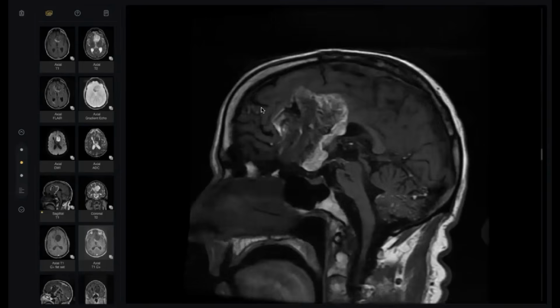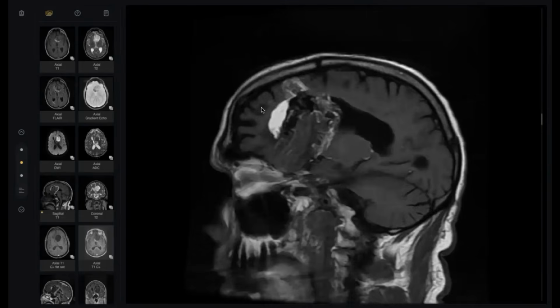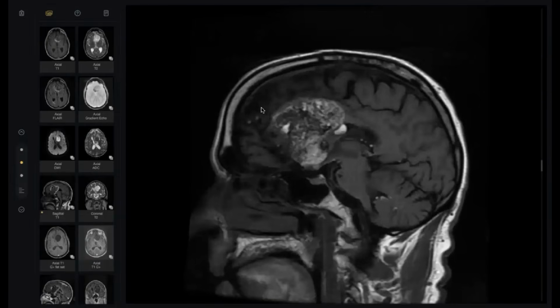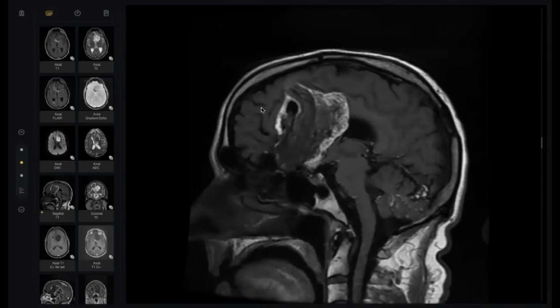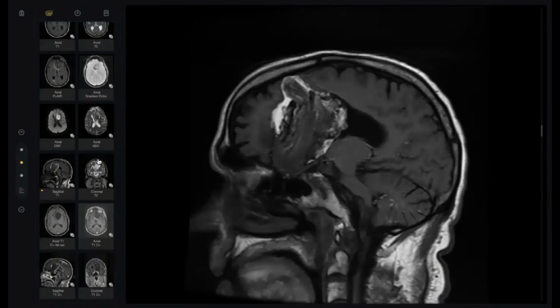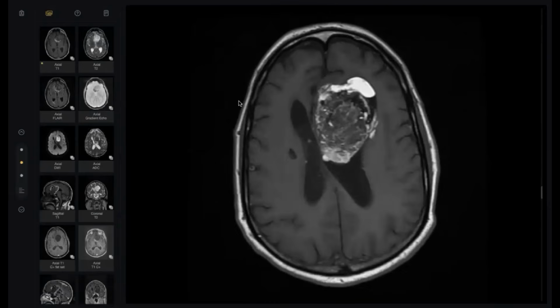What else? I'm suspecting... I can see the lesion displacing or compressing the suprasellar cistern contents downward. I can identify the infundibulum. What's your diagnosis, doctor? I'm concerned that the lesion is an intraventricular lesion. My differential diagnosis will be choroid plexus lesions.